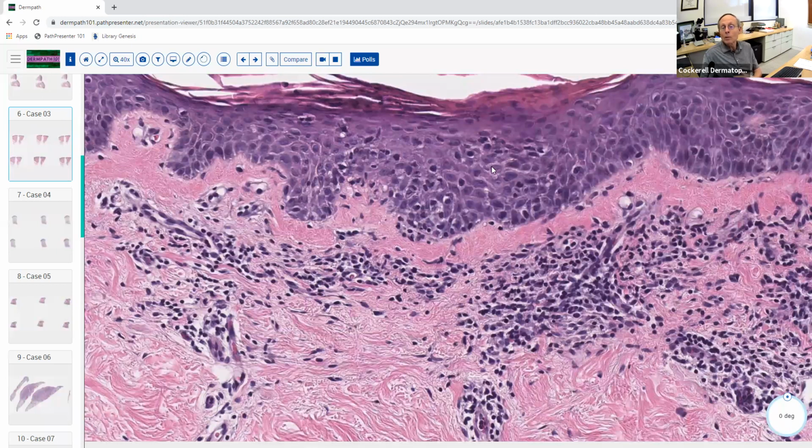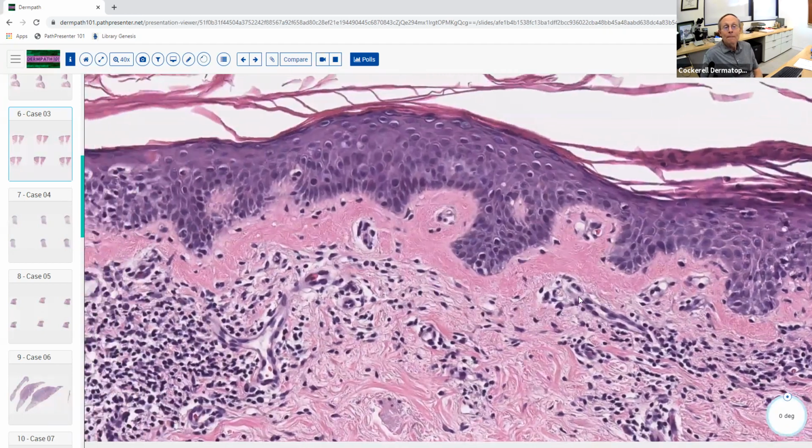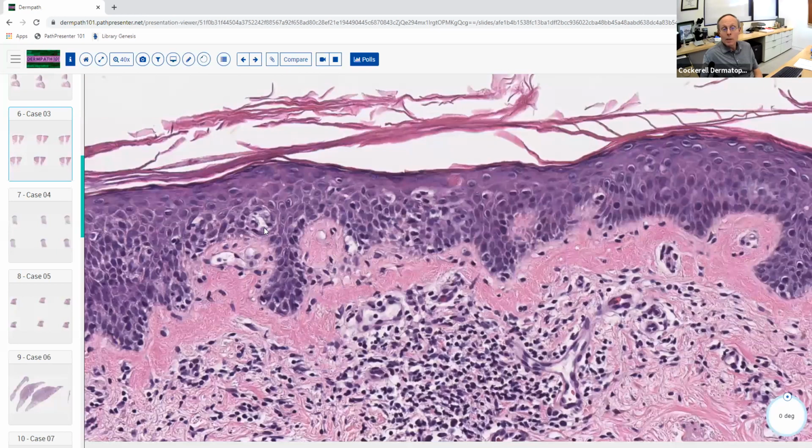Now, if you have a spongiotic dermatitis like contact dermatitis or nummular dermatitis, you can get lymphocytes in the epidermis, but you usually have relatively prominent spongiosis. So there's a balance between the amount of spongiosis and the amount of lymphocytes. Getting quite a few lymphocytes with minimal spongiosis should be a red flag for a certain diagnosis. Like MF? Yeah, like mycosis fungoides. Here you've got a little bit of spongiosis, but it's not like a small microvesicle. You've got a lot of lymphocytes in the epidermis over here.